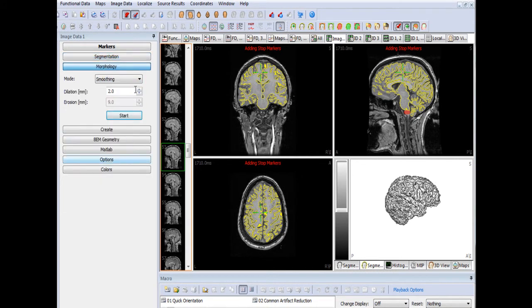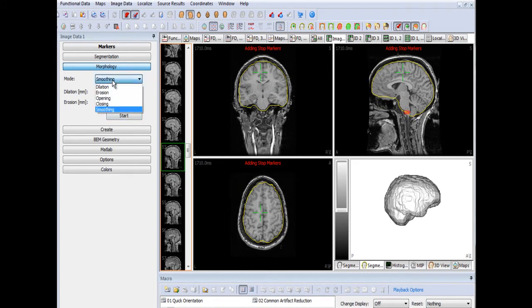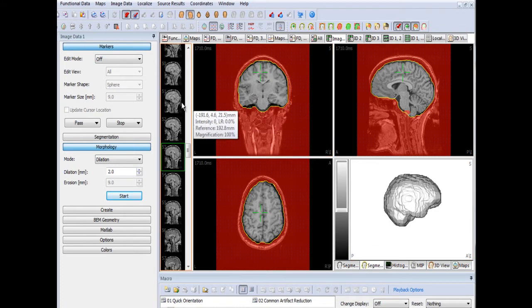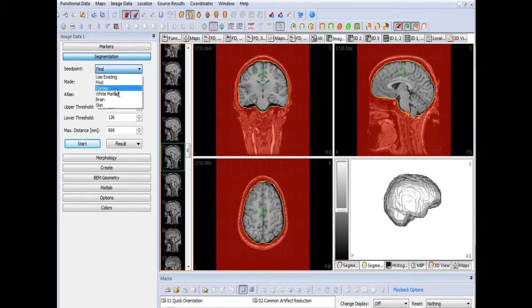Our ultimate goal is to have the best and most accurate representation of the cortical surface for an individual, so that when we are looking at the alignment of the grid relative to the brain, this will be able to help us in further surgical planning. We are now completing the segmentation of the cortical surface for the brain, and we will see that segmented cortical surface here shortly.